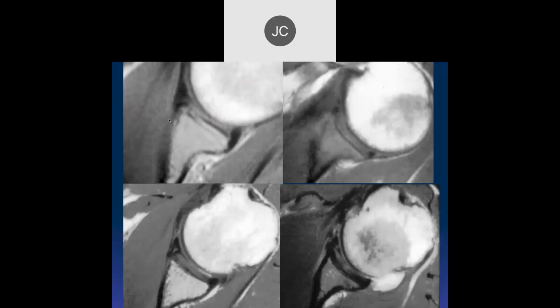So here, the ABR view, again, was suspicious, but not definitive. And then if you look at this, this is a normal labrum. This is the normal cartilage at the base of the anterior labrum. Here's a labral tear. It's actually out in the periphery of the labrum proper itself, separate from the articular cartilage, which is down here. Here's another labral tear, basically articular cartilage here, a separate area of high signal intensity, which is the tear in the anterior labrum.